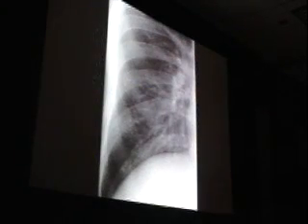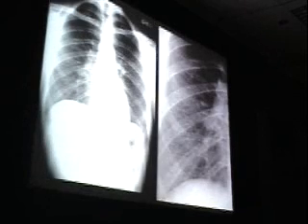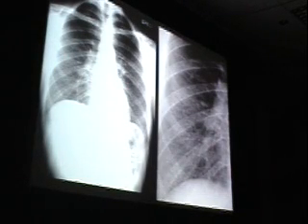Let me blow that up a little bit. You'll see these very similar sized nodular opacities scattered throughout the lung in a uniform distribution. And if you look at CT on this, again, you get these small nodules throughout the lung. This is miliary TB. Now, the one problem with saying miliary is, my experience has been that, particularly with residents, if they describe the pattern as miliary, the only thing they can ever think of after that is tuberculosis. Miliary equals tuberculosis in their mind.